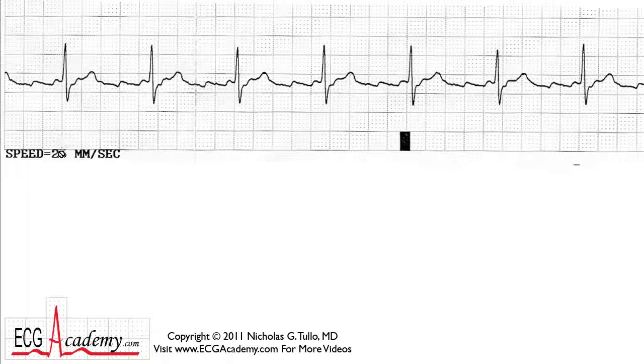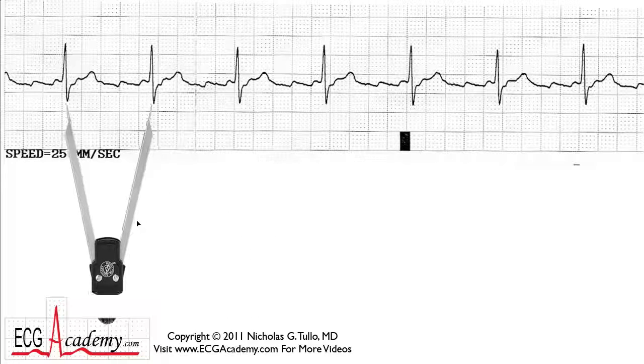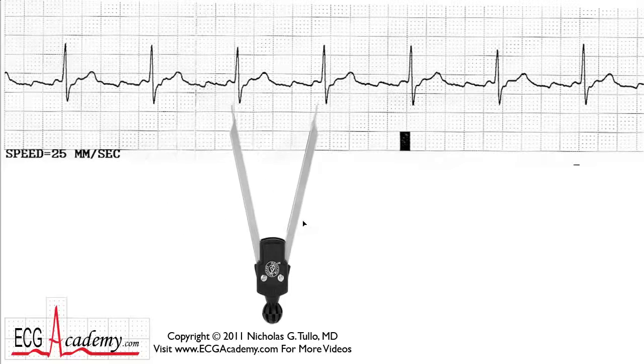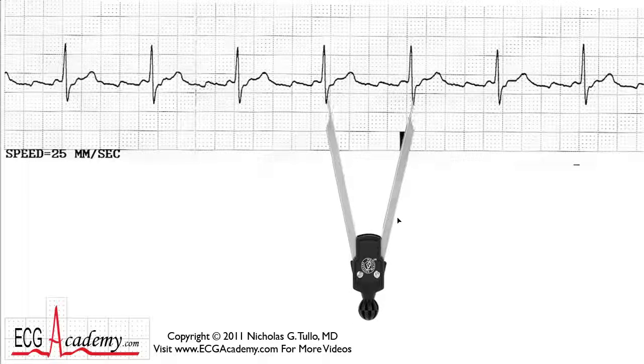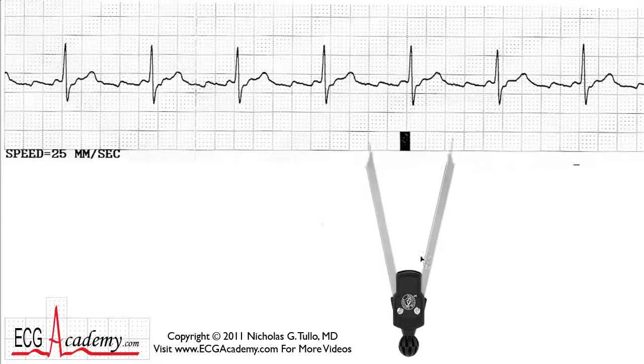Anyway, let's look at the forest first. You see the QRSs kind of marching through, and they look pretty regular. Let's grab our calipers and see whether they are indeed regular. So put them down. I happen to have them at the right rate. And the QRSs certainly do appear to be very regular. So, that's kind of interesting.